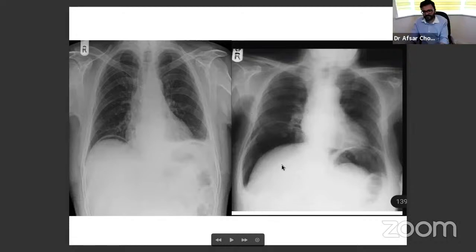I think it's all like whether it's incidental or not, and especially elderly patients, you have to be careful. They may not show signs of peritonism initially. So if there is any suspicion, definitely you have to do CT. And in all these cases, the previous X-ray will help confirm that patient has colonic interposition. In this X-ray particularly, you can see there is a separate air lucency line here as a crescent there. That's outside the bowel. So definitely there's pneumoperitoneum there.